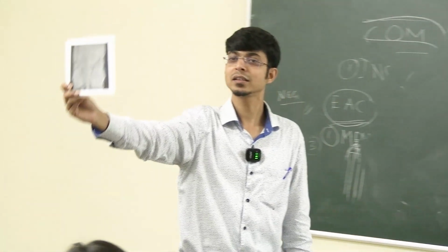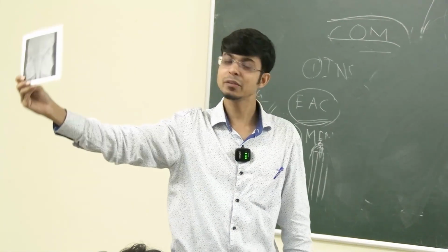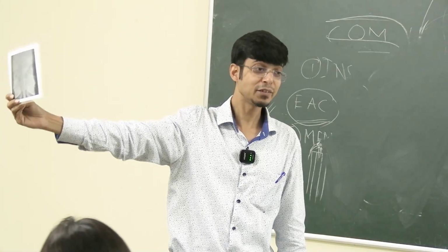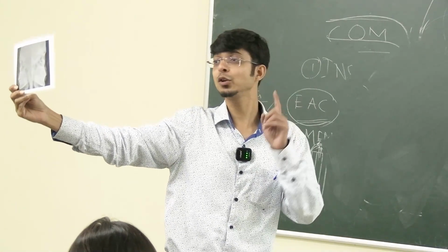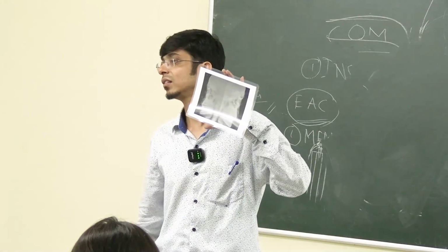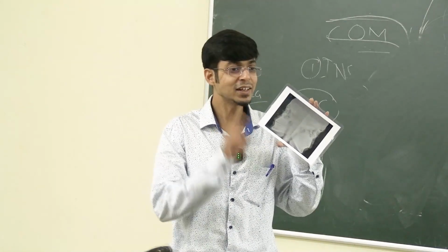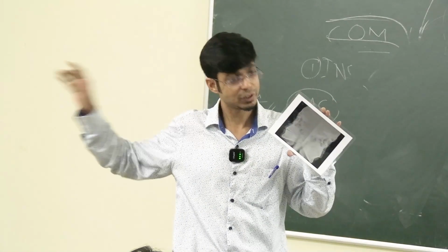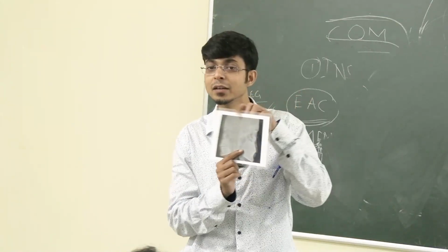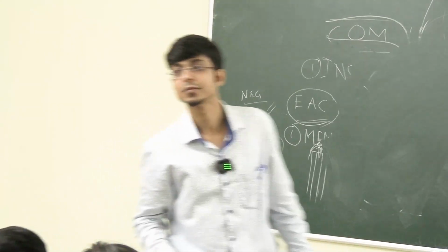Who on earth does a lateral view for sinuses? The examiner will throw you out of the examination room. Never say that. The only reason we do a lateral X-ray of the nose or sinuses is to see the nasal bone. For sinuses, we never take a lateral view. Remember it. This is a fractured nasal bone. Now see closely. I'll explain the things.